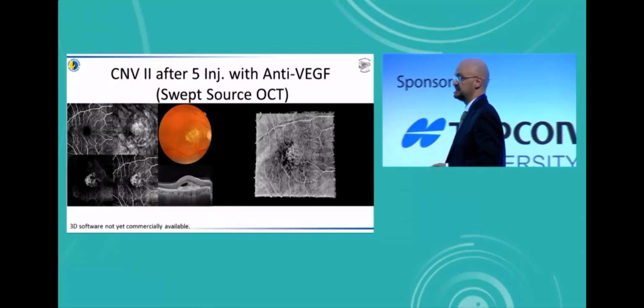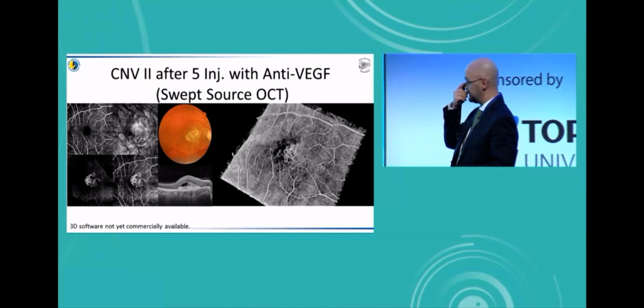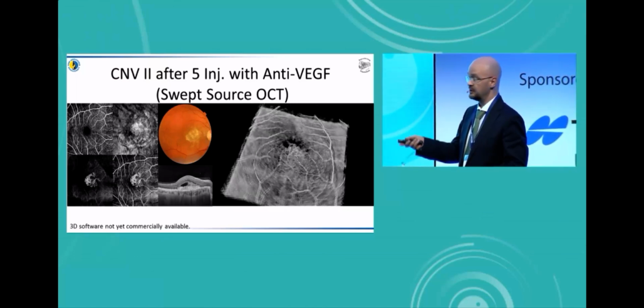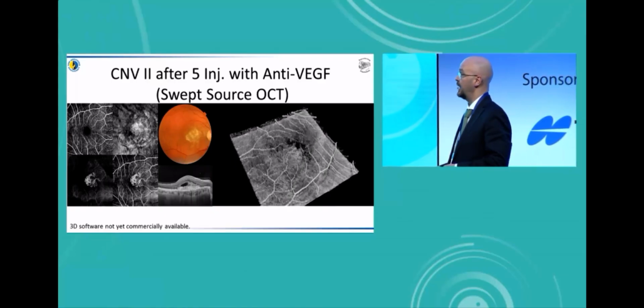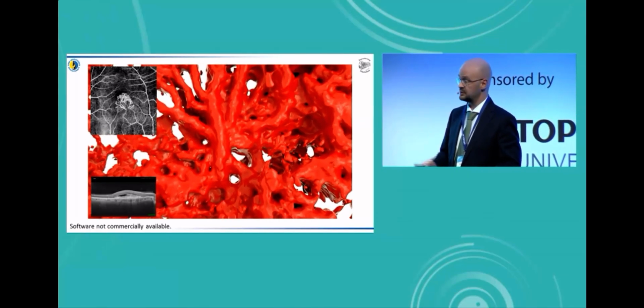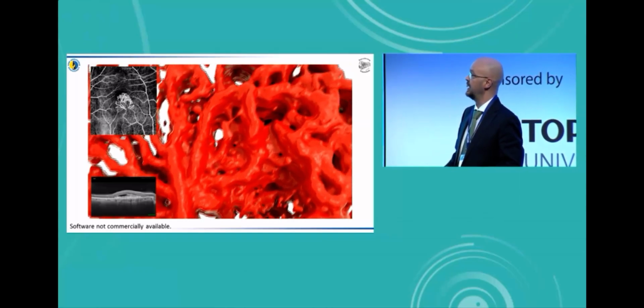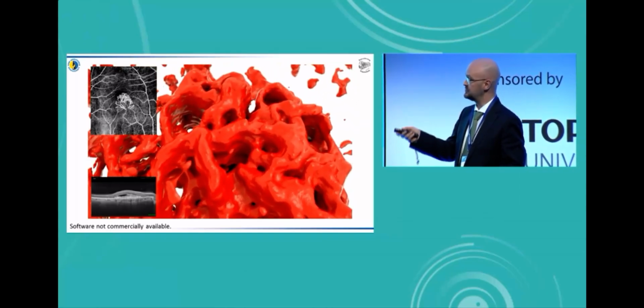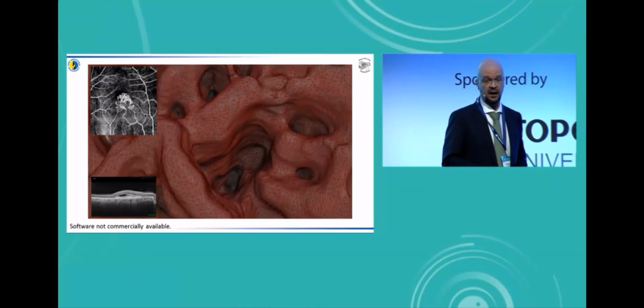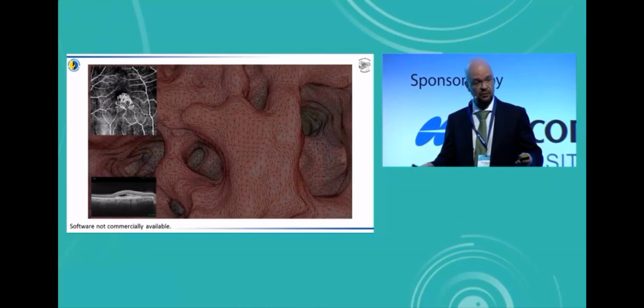So you obviously saw before that a lot of my research involves creating three-dimensional reconstructions of swept source OCT data. And I also, of course, create three-dimensional reconstructions similar to the ones that Peter was making, because I think that we can use these kinds of reconstructions to do volumetric analysis of the lesions and see how they grow and how they shrink.